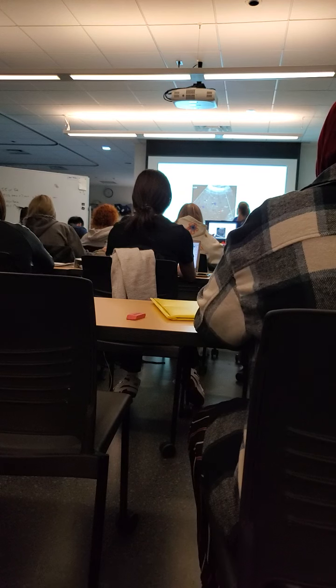And then extrahepatically, that would just be, hey, our common bile duct should measure this, and it's measuring larger than it should. We're not going to see a bunch of ducts outside the liver, just that main extrahepatic ductal area. So whether it's common hepatic, cystic, gallbladder, or common bile, it's just going to be bigger than it should be. Whereas in the liver, we see a true branching and dilation. And that's those echogenic walls that we noticed besides the vascularity there.